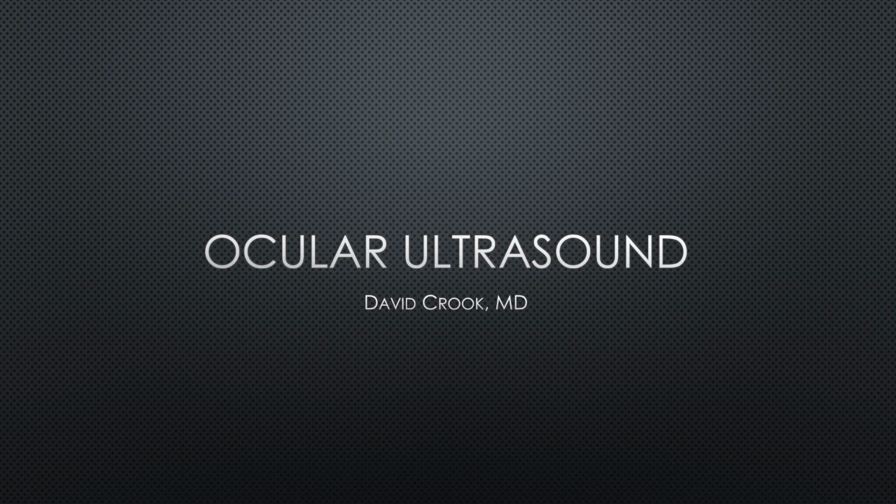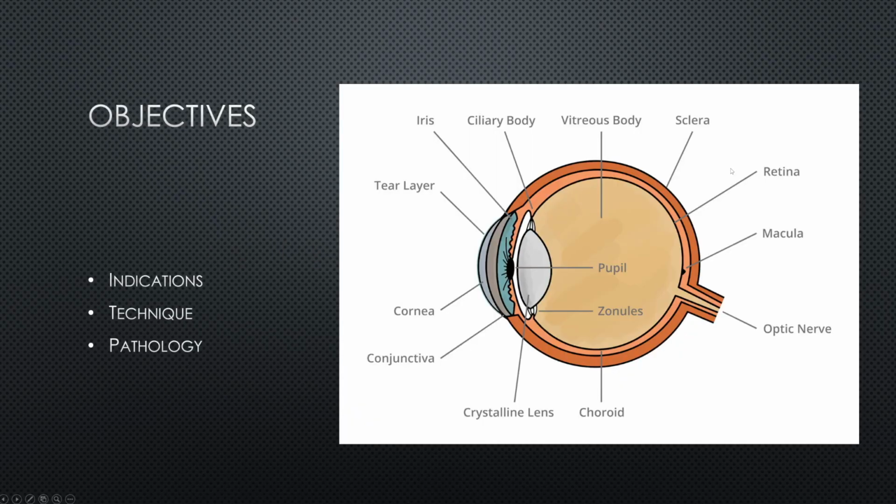Welcome back. Today we're going to be discussing ocular ultrasound. So the objectives today are to look at the indications, why we do this ultrasound, a little bit about technique, how we do it, and then pathology, looking at the different things that we can see on our ocular ultrasound.